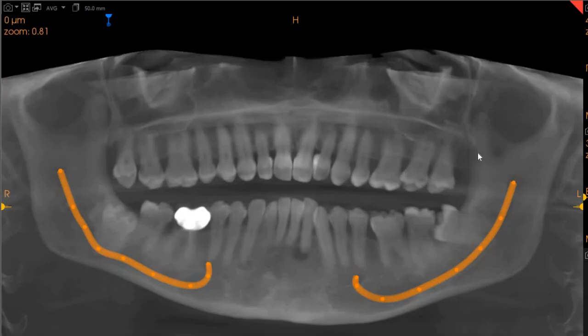This is the CBCT of the patient which you had requested. The area of interest is the wisdom teeth on the lower right and the lower left hand side. Moving to the lower right hand side, this is a vertically impacted wisdom tooth that you can very clearly see.